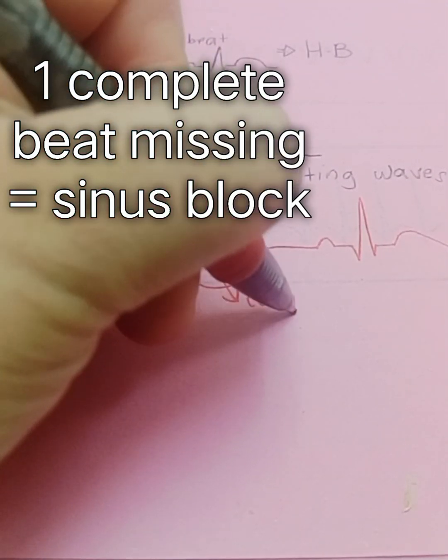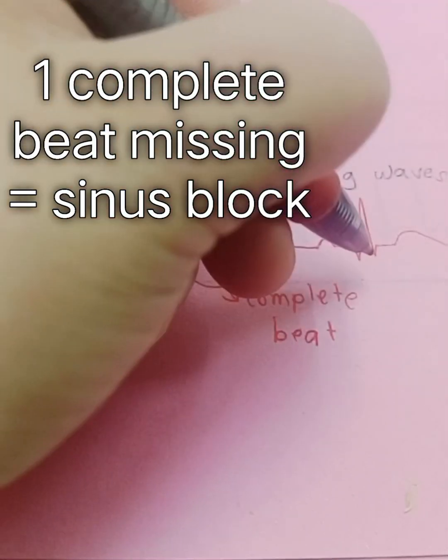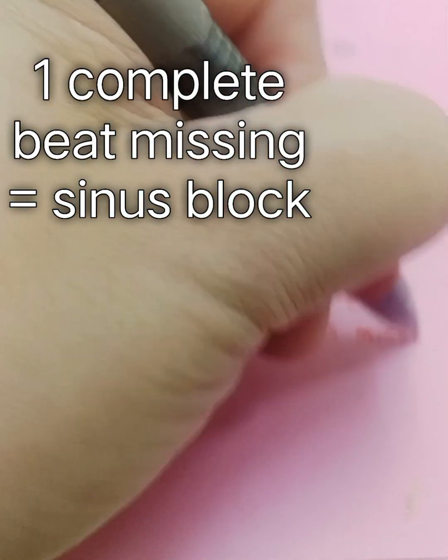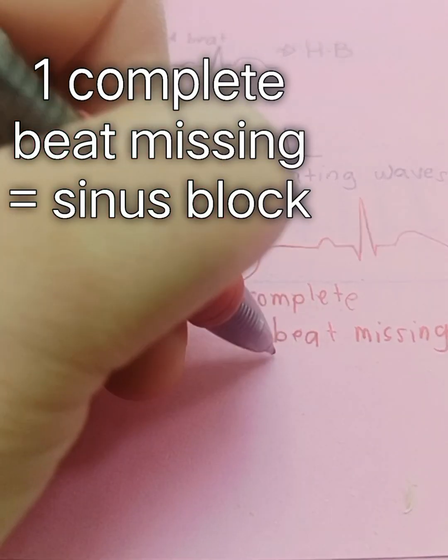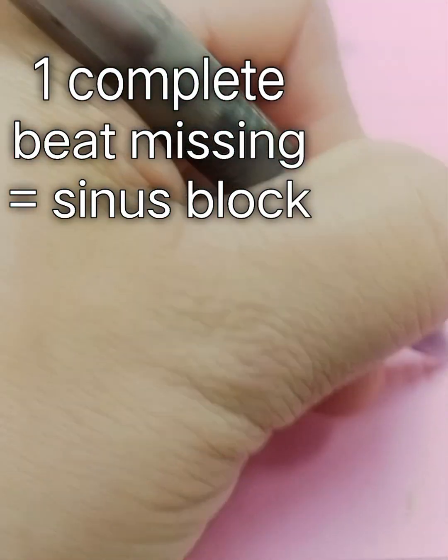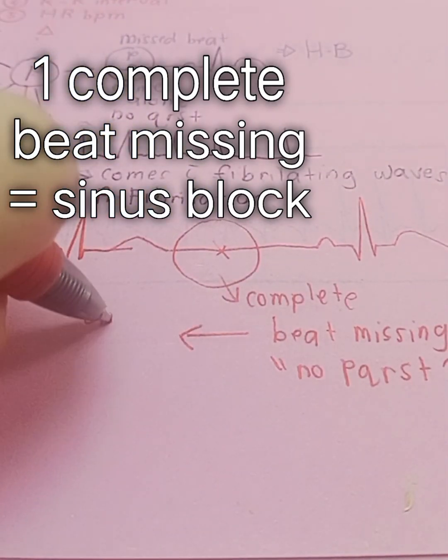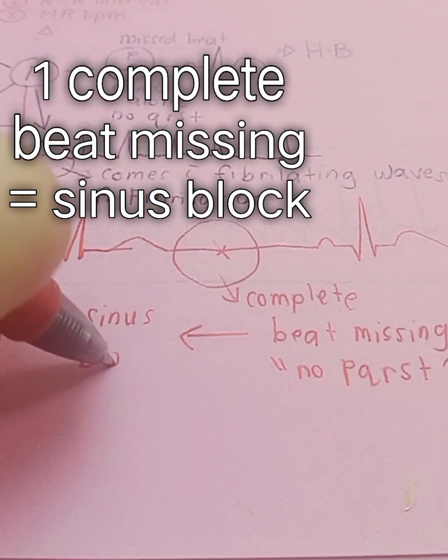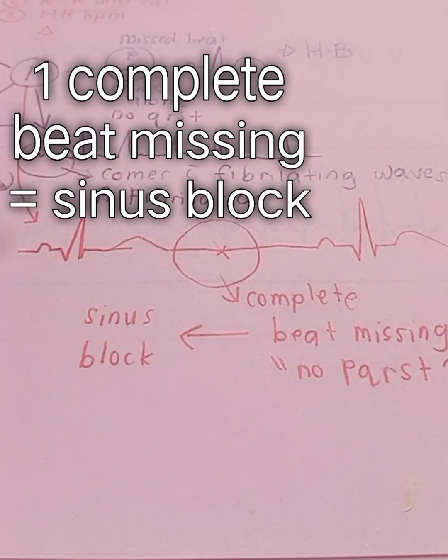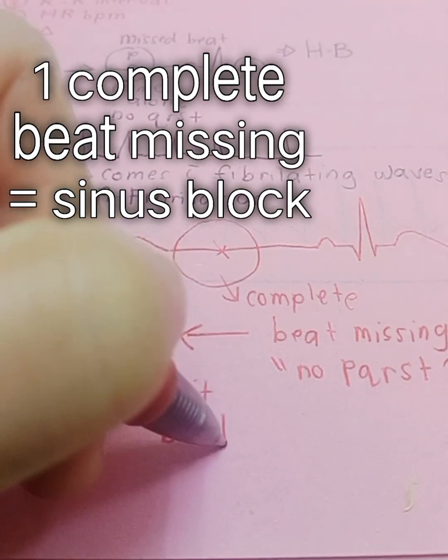There is a complete beat missing here. Complete beat missing. No PQRST. This is what we call sinus block or exit block.